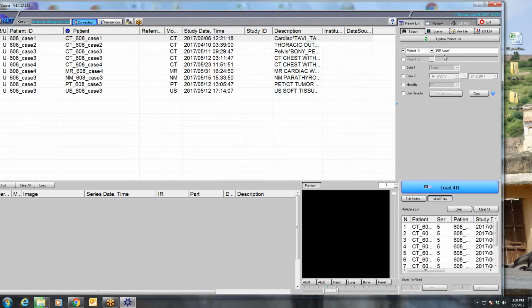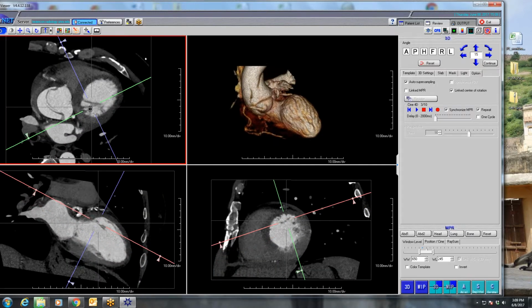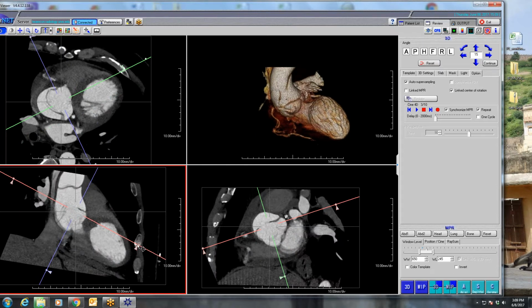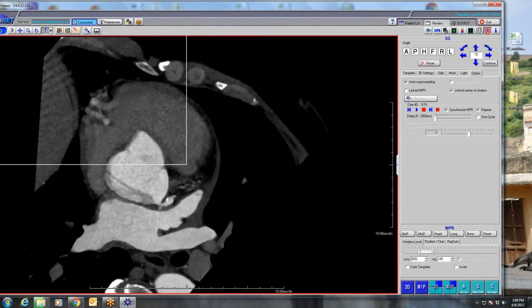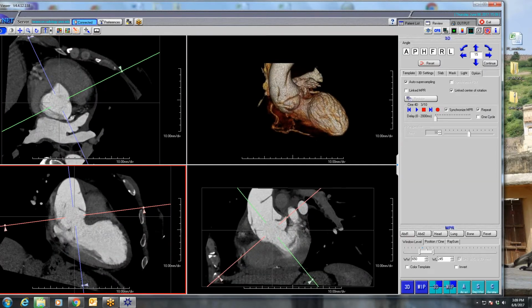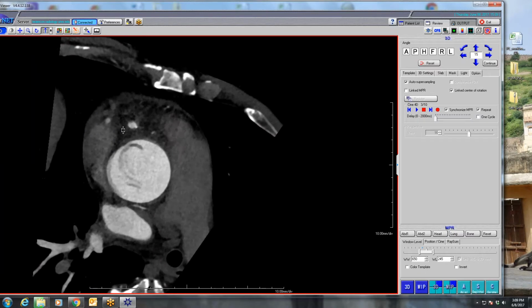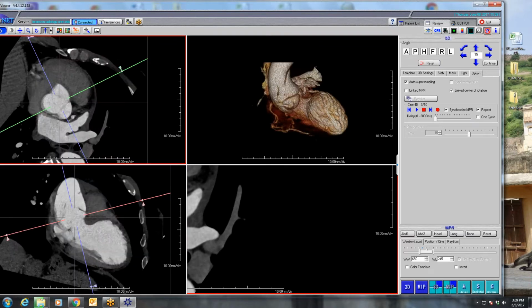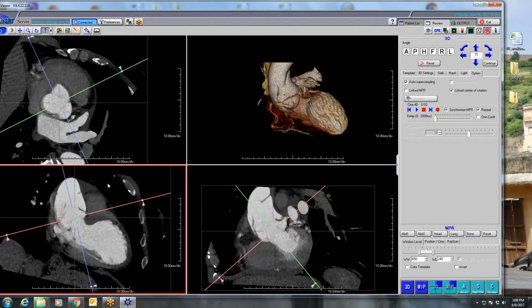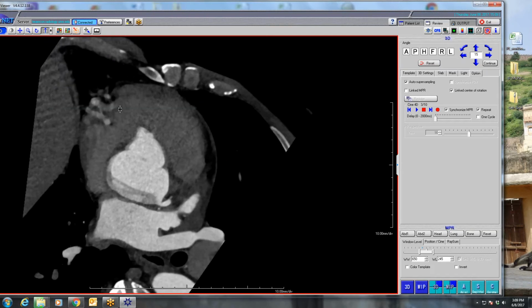Hey, Seth, is he Marfan's or some sort of elastopathy? It looked like he kind of had that annuloaortic ectasia look. That's a good question. Not that I heard of that I know, but you are right. His aorta and his aortic root is quite dilated. I was just shown this case yesterday or today, very briefly, so I didn't look up his history, but you're right. His root is quite dilated. Yeah, it's dilated, and I agree. He might have some sort of cystic medial necrosis or annuloaortic ectasia, but I don't know if he's marfanoid or not. I guess it's a moot point.